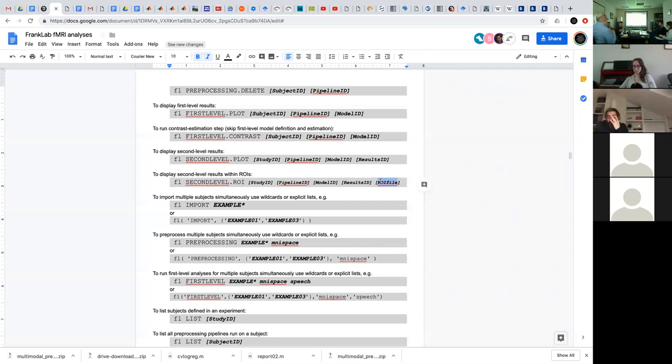No, you can have an atlas ROI. You can enter multiple ROIs within a single file as long as they are not overlapping. ROIs in a file can be defined by numbers, integers from 1 to any number, 100 if you have 100 ROIs. Every voxel has a number. If it has a 0, it doesn't correspond to any ROI, and if it has a particular number, it corresponds to that particular ROI.